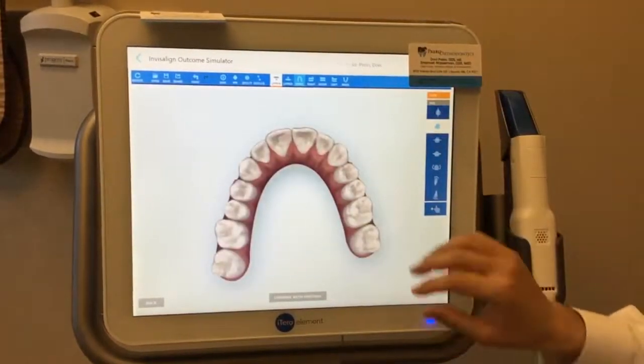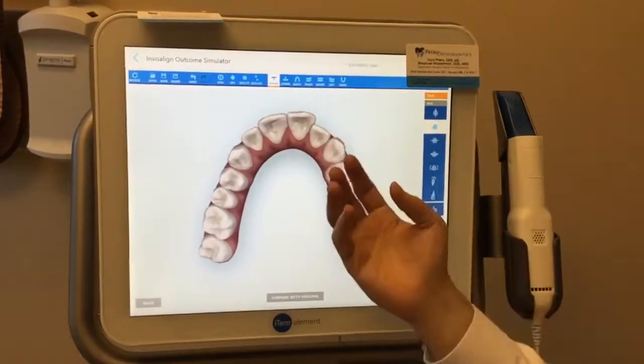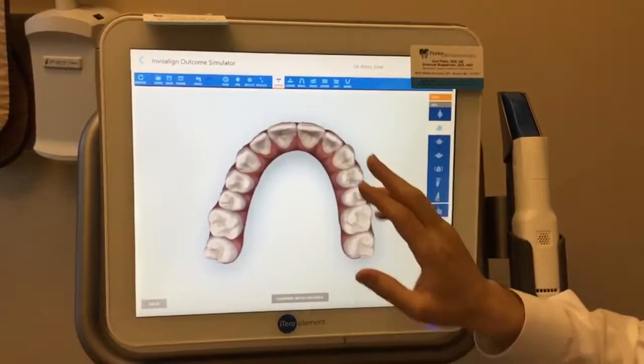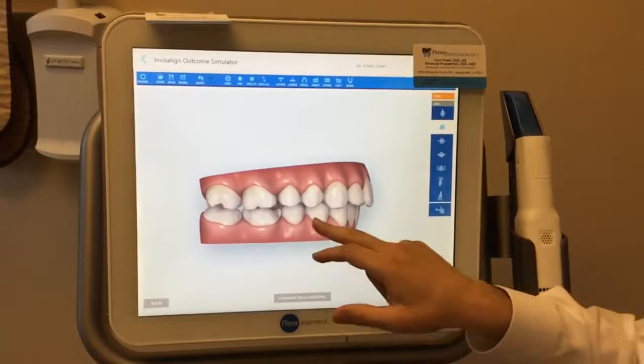Let's take a look at the upper teeth. On this patient, some crowding and some flaring of the upper incisors, so we're simulating the retraction of the upper incisors here. And remember, I haven't touched this. This is what has the automatic simulation that's been given to me. You can see she's half step class 2 all the way down.